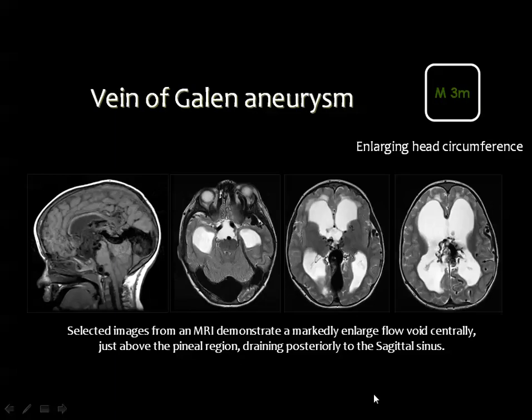Whenever you see a CT scan or MRI and you can see an enormously dilated signal void vascular channel in the region of the assumed vein of Galen, and is usually drained through the straight sinus into the confluence of the sinuses and maybe in the transverse sinuses as well. And this is, as I have said, a high flow fistula which commonly results in congestive heart failure.